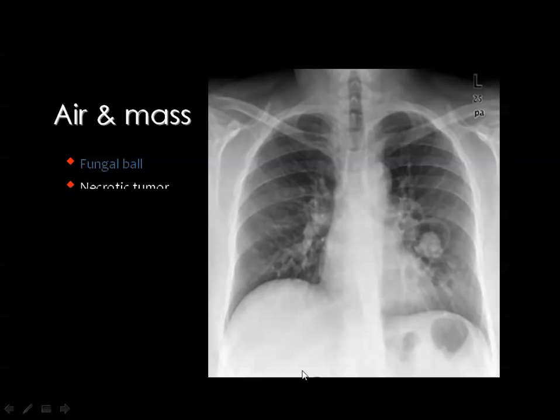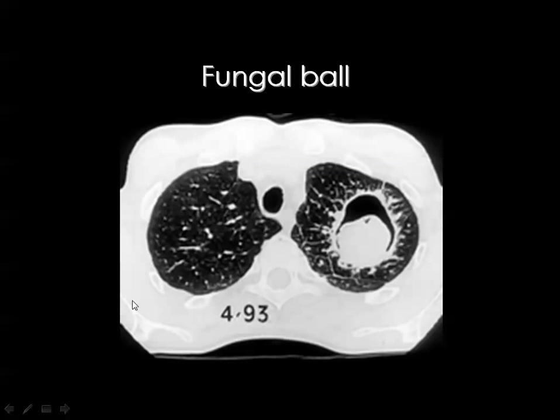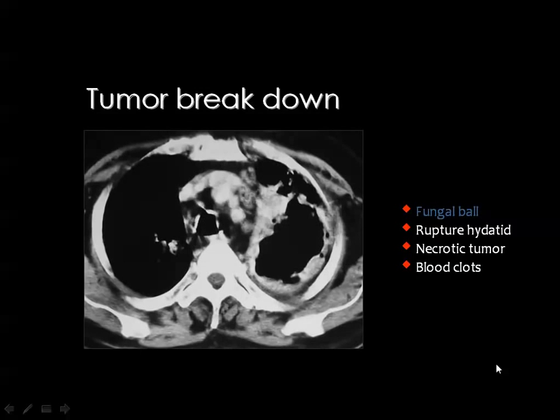And this is the classic appearance of a lung abscess with a straight air fluid level in the right lung. Then if you see a cavity with a mass inside, this is a fungus, what we call the fungal ball, the mycetoma, or the aspergilloma. Actually, this aspergilloma arises on top of a chronic pre-existing cavitary lesion in the lung, usually of tuberculous etiology, and it is usually located in the apex of the lung, as you can see here in this example by CT scan of a cavity with a ball inside representing mycetoma, aspergilloma, or fungal ball.